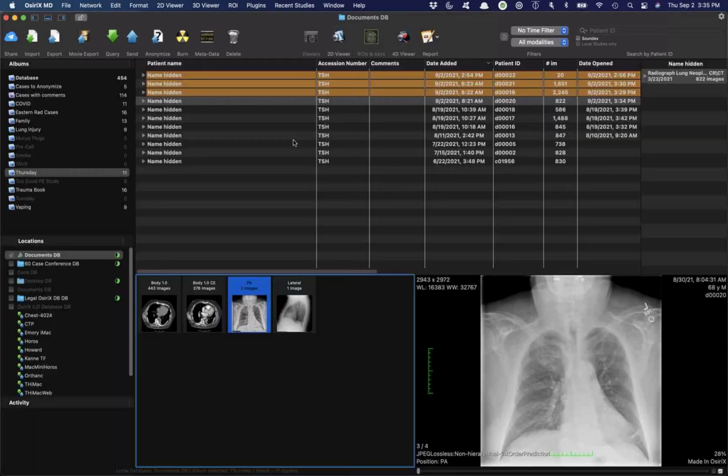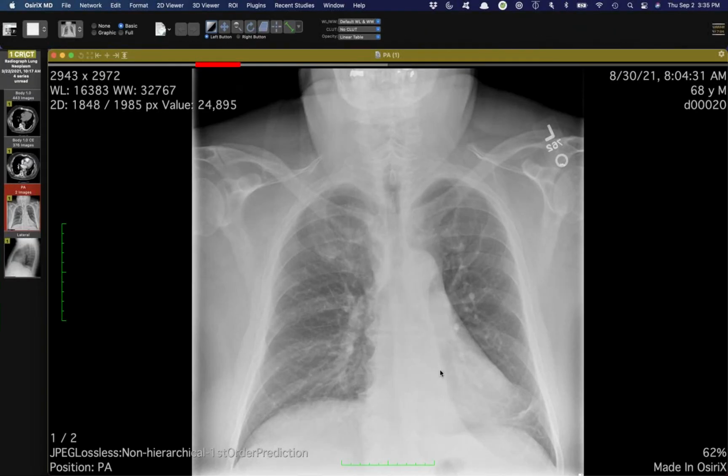And it's one of those ironic things that the worse it is, the more collapse there is, the harder it is to see, because it can disappear altogether. This one is visible on the frontal, but sometimes the degree of collapse is so great that you don't even see it on the frontal. Yeah, it's almost just straight up and down like the aortic interface. Yeah.